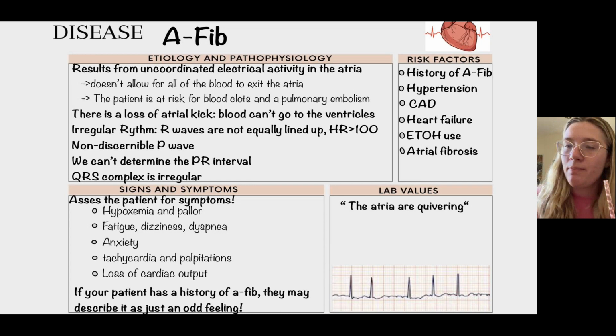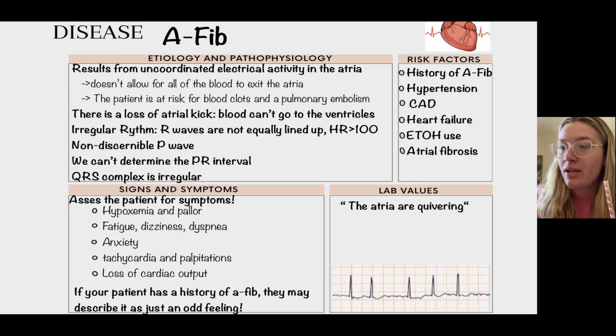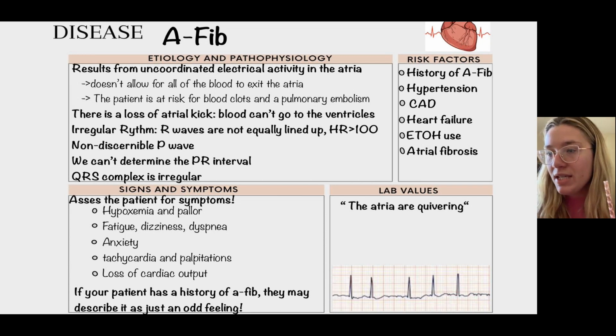And then from my fourth to my fifth, it's also a little bit medium. Okay. So yeah, and if this were a 3-second strip, we count 1, 2, 3, 4, 5, 5 times 20, and then we kind of work from there. Okay. 100. Okie doke. So what are some symptoms these patients might have?